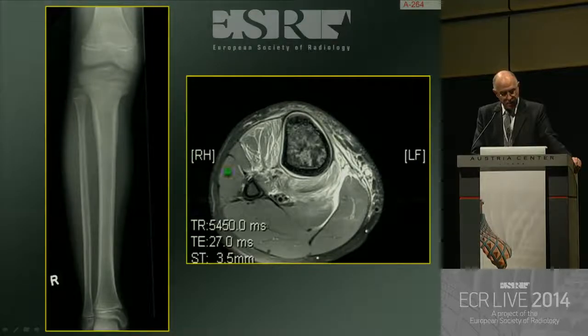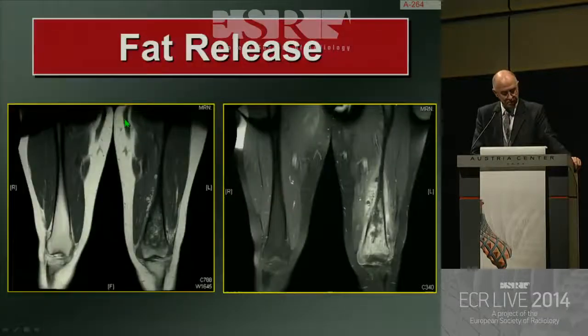And can you see periosteum by MR? Yes, you can, because it is elevated by the presence of fluid, as we said on that diagram, between the cortex and the periosteum, and therefore it will also be seen as being elevated, but in a different way on a plain film. You only see it when it starts forming new bone formation.